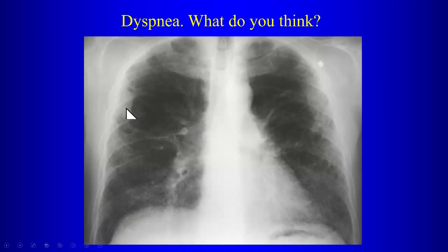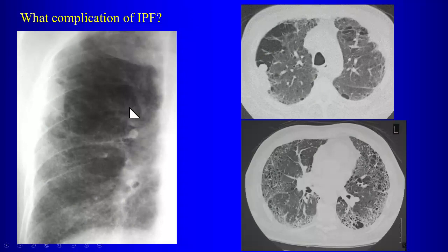Okay? So what's the point? The point is when you're dealing with idiopathic pulmonary fibrosis or fibrotic interstitial lung disease, you have to have a high index of suspicion for lung cancer. This is the third most common cause of death in these patients. This is a lung cancer. And this patient also has this idiopathic pulmonary fibrosis. Why does it look so oblong and funny, hyperdense? Well, these are lung windows. I mean, it's not calcified, right? It's not quite calcified, but these are lung windows.